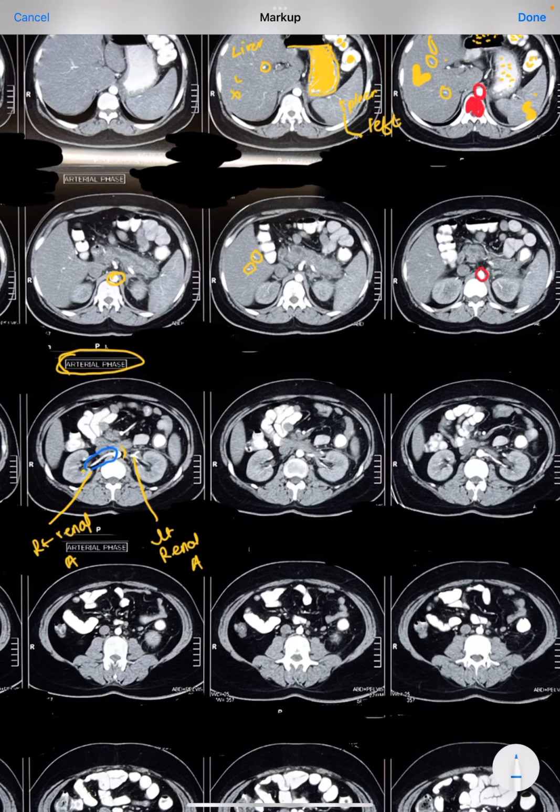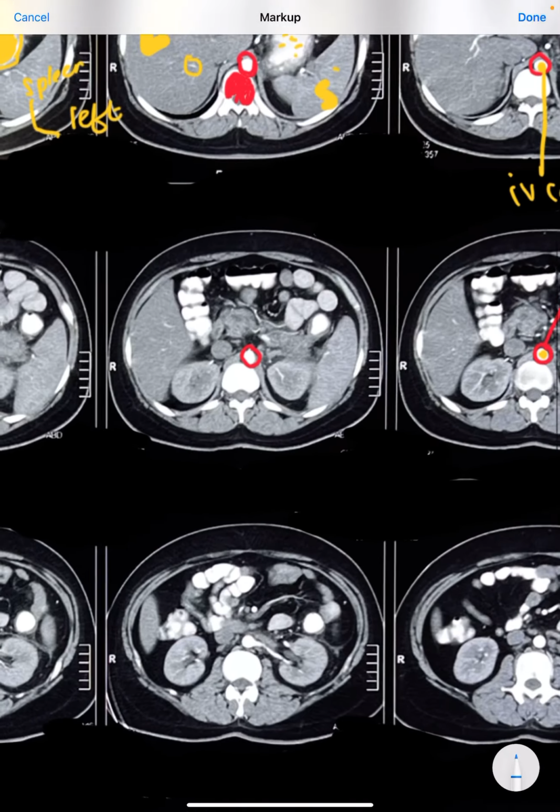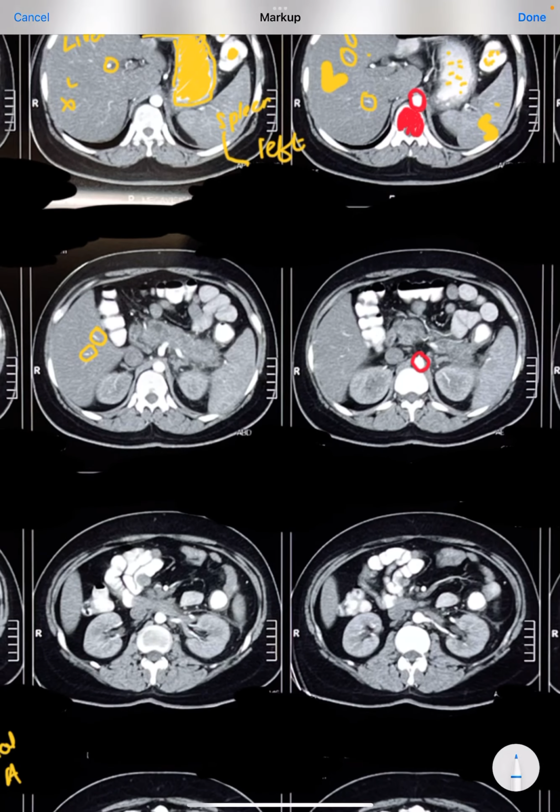The most important thing I wanted to tell in this is that this is a beautiful CT image showing pancreatitis. Whenever you want to diagnose some pancreas issue, you must first find the pancreas. How to find the pancreas? You must know the anatomy. The pancreatic tail touches the spleen, so just find the spleen. This is the spleen, and the part which is touching here is all pancreas.